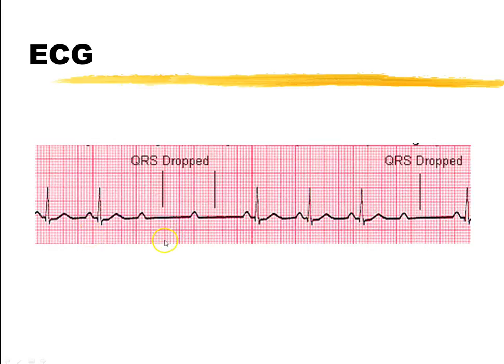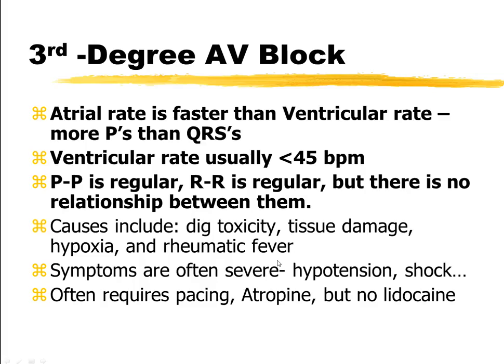Similar things are going to happen here. So what is the rate here? We just skipped that step, went right on to the next thing, because I'm trying to go fast. But 1, 2, 3, 4, 5, 6, 60. We are at the bottom range of normal here. So if this person is used to having a rate that's more like this, then they're going to feel it. You're going to feel yucky.